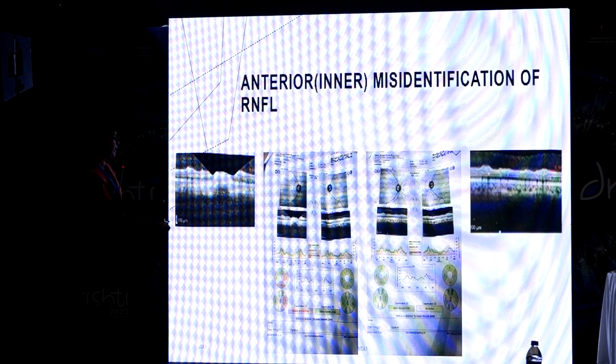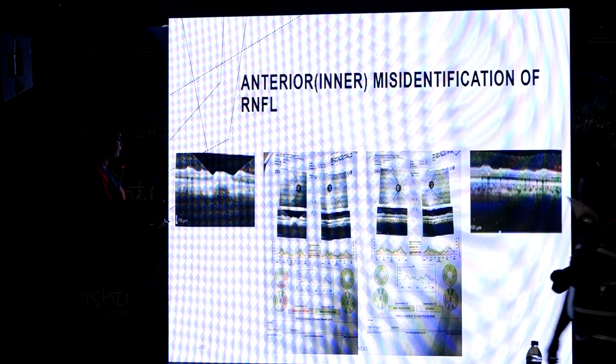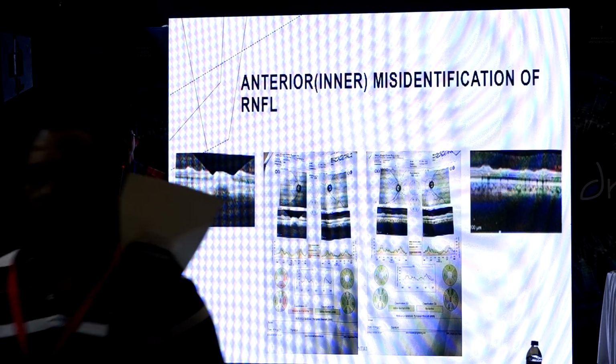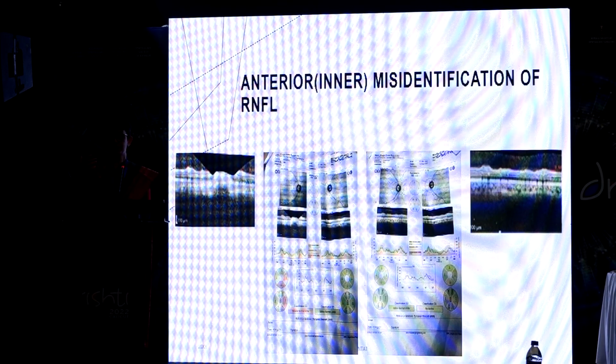So this segmentation failure, when you see things touching the x-axis, it's better to go for an examination of the screen of the OCT machine rather than to look into the printout.